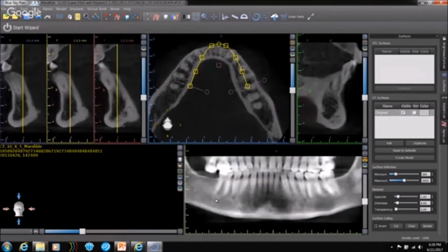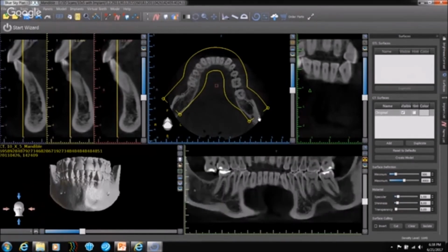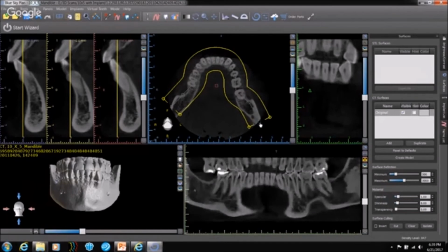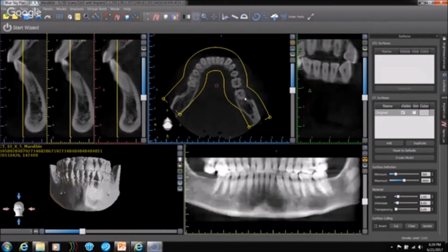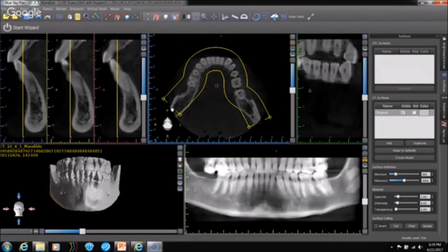Well, probably by actually restarting, we can go over a few things just as we did. One of the critical things that I usually do when I get an implant site, when I do implant planning, is that I make sure that I get all the anatomy that is captured in the image. And sometimes you might have to do a little bit of adjustment just to get that. You would also have to adjust certain areas, as you see over here what I'm doing.